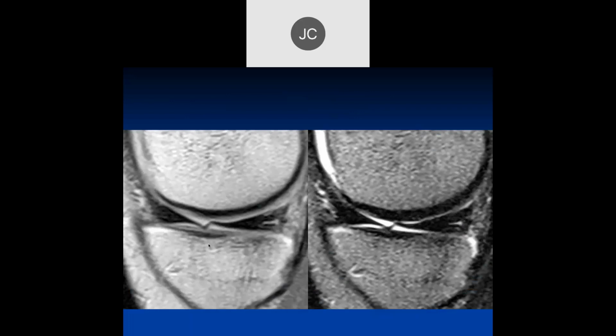One of the reasons you see that is you can predict that that joint is kind of loose. Otherwise, you wouldn't see that buckle. A firm joint will not give you that kind of appearance. So I would probably guess that this is a female, and the joint is quite loose.